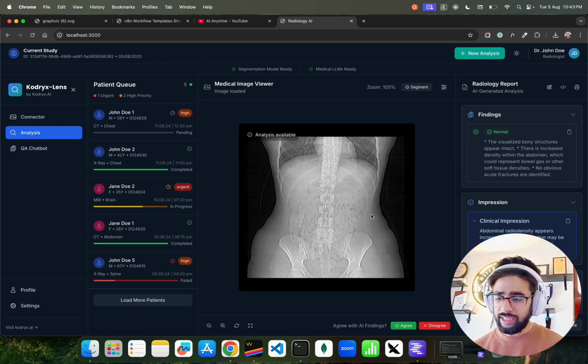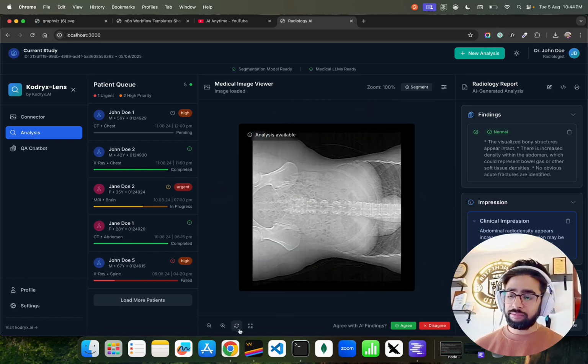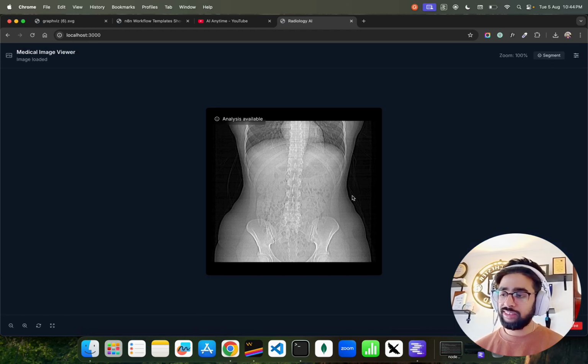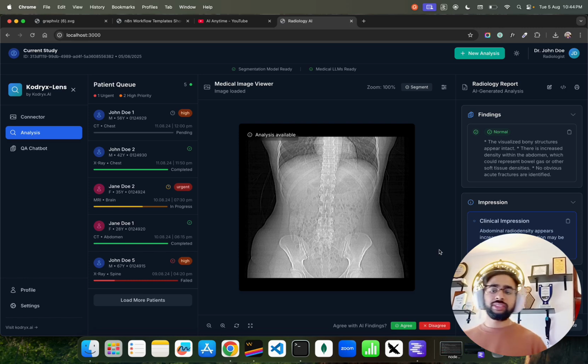Click here, go back. Same thing, you can also rotate this. So we have that. Yeah, amazing, right? And you can again do it from here. You can also maximize this. If you maximize, you can see it over here that we did maximize it. Now, you can again minimize it further. If you agree, you can just hit agree. It saves in the database.